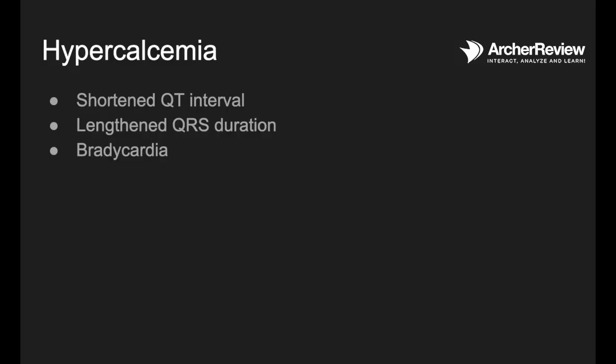Let's get started with calcium. All right, hypercalcemia. What happens when you have too much calcium in your blood? This will cause shortened QT intervals, lengthened QRS duration, and a very severe bradycardia. So too much calcium: shortened QT interval, lengthened QRS duration.